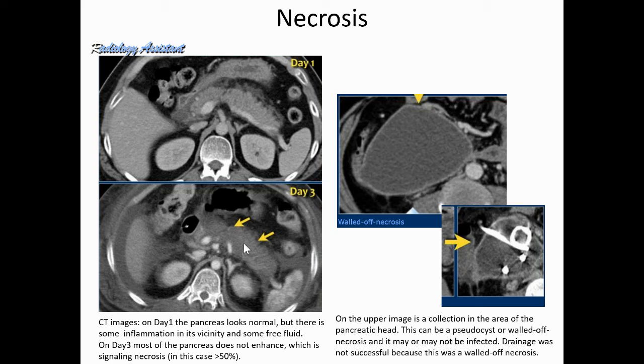If the necrosis is small or not detected and not cleared out, then it can also assume a wall around it, and then we will see a lesion which is quite similar to the one that we saw previously, the pseudocyst. However, these lesions contain a much denser fluid which can be measured. However, on some occasions they can look exactly the same.